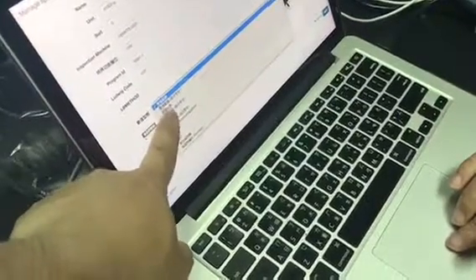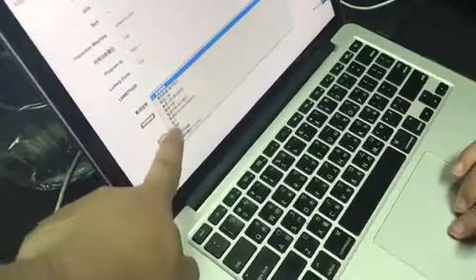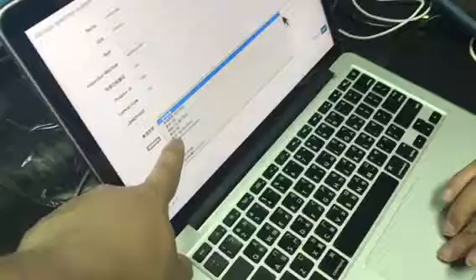You can base on the upper limit and lower limit. This is set up for the reference range. It could be an element, a testing, an option, an image, or even a positive or negative sort of thing. And you can also set up different reference ranges depending on male or female. Okay. So you can see here, if it's a range like from 10 to 50, you can choose right here, and you can also change this for the reference range.